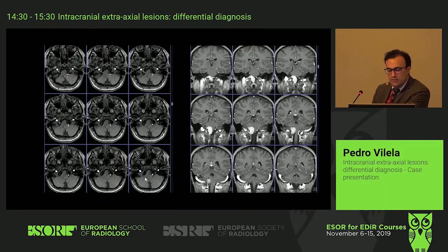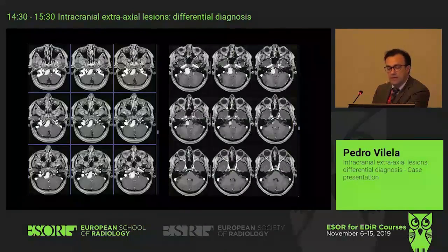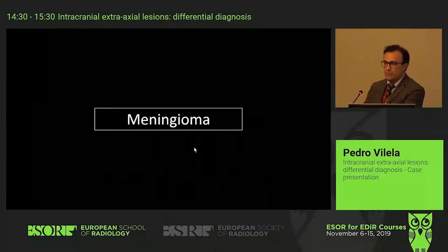In this location you can have a tumor coming from the jugular foramen or the hypoglossal canal that is there, or the bone or the meninges. In this case, it's clearly a meningioma. Okay, important topographic relations that you need to report are with the brainstem and with the vertebrobasilar system. Okay? Very good. Thank you very much.